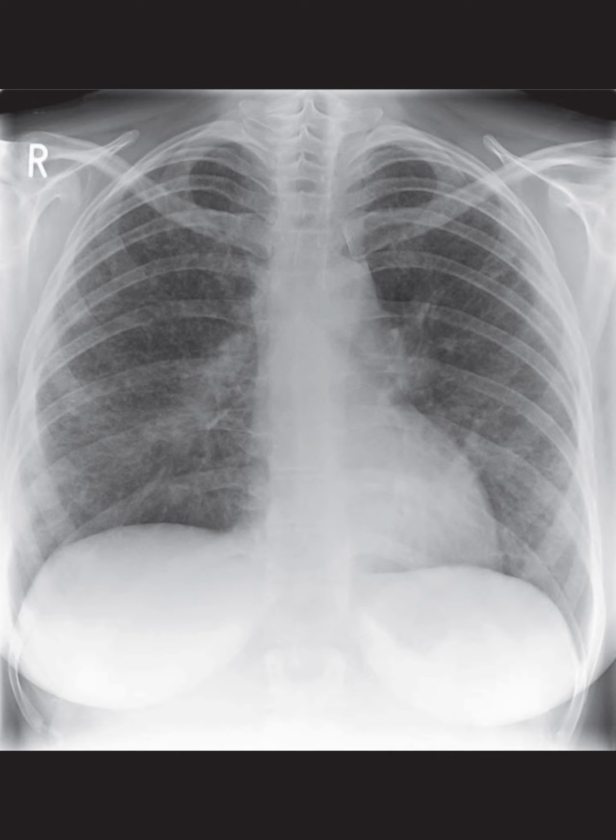Today we're looking at a fascinating case, a frontal chest x-ray of a woman. Let's dive into it. Right off the bat, you can see there's a lot going on in this x-ray. The most noticeable thing is the diffuse lung disease on both sides, with a lot of interstitial shadowing throughout. But interestingly, the costophrenic angles are relatively spared, which can be a bit of a clue.